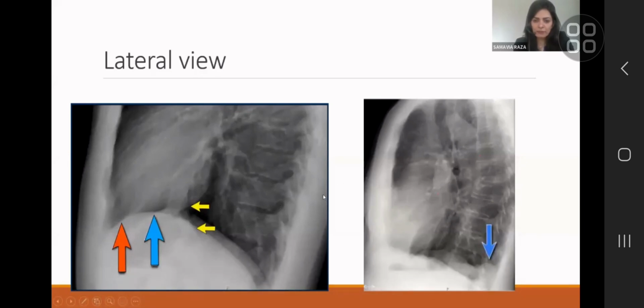In terms of the vascular structures, like I said, in a thin patient, you should be able to see the aorta, but you can almost lose it beyond the arch, and that is normal. What you imagine, thinking about it in a schematic or diagram way, is you expect the aorta to be seen all the way down. You don't see it. So the ascending aorta, in most patients, you can see it.